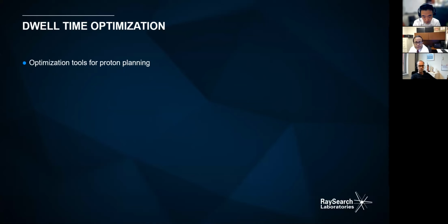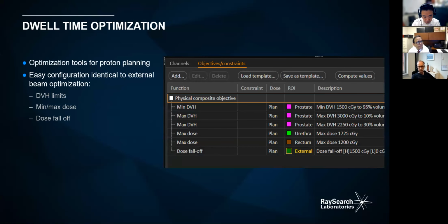We do have tools to specify your dwell times manually and scale. But we do see a big strength in our tools for inverse planning and optimization. We have adapted our optimization tools, which are used very successfully for our proton planning, for dwell time optimization.